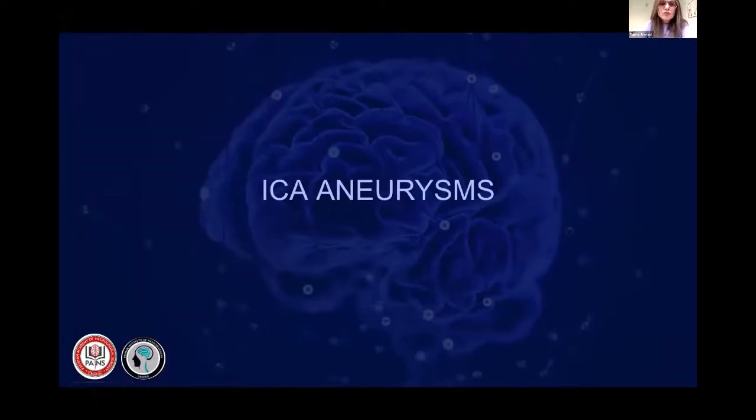So next we move towards the ICA aneurysms. I will not talk about the exotic, bizarre and exceptional types of cases. I will talk about very simple cases which I have seen in my daily life. Most of these cases are not my cases. I have picked these classical cases from Maxim Shapiro, from his group, because I want to show you very classical cases with the segmental boundaries.